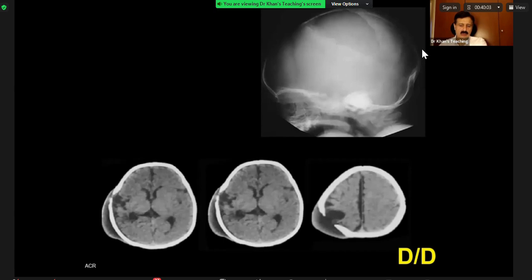And usually because of CSF pulsations, it might go out of the dura, and then it grows because of CSF pulsation. And clinically speaking, there will be a boggy type of swelling there. On imaging, this is what you can get. But usually, leptomeningeal cyst will be asked on a plain film, and you can see there is no marginal sclerosis.